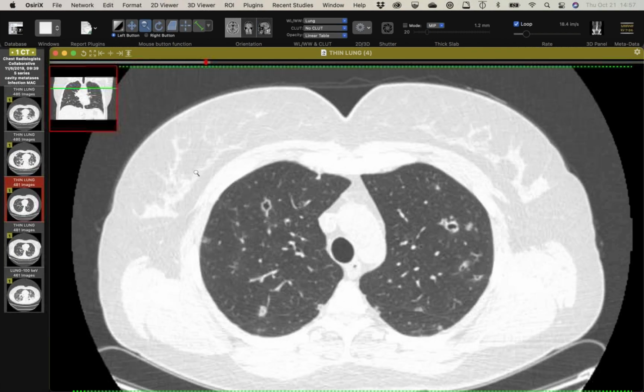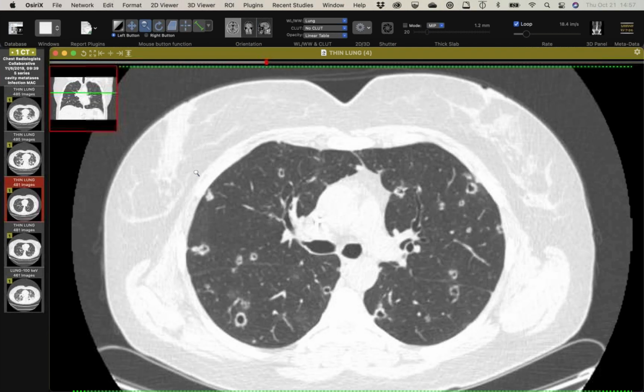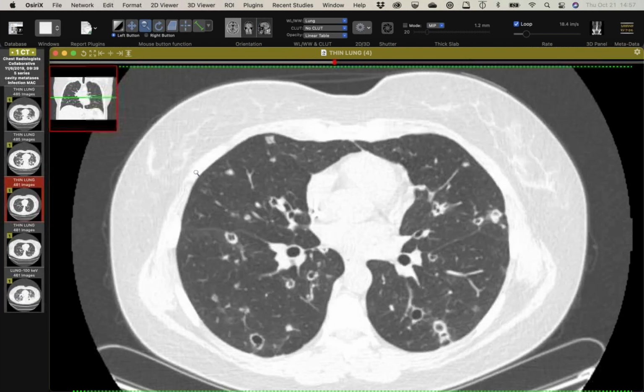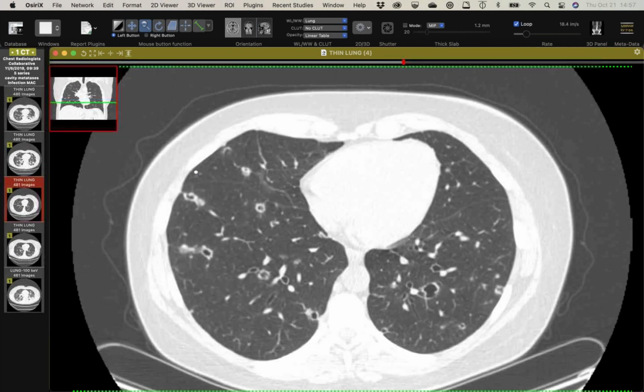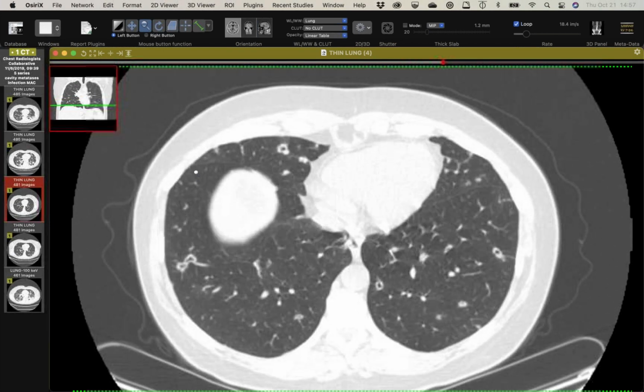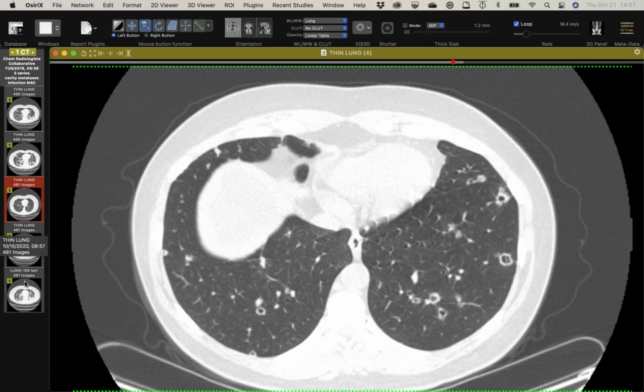They're not quite cystic, cavitary, whatever you want to call them, but they're not solid. And she has a whole bunch of them. And so these have been there for now several years. And she's been on a variety of chemo regimens and bevacizumab and some other targeted therapies. And they were kind of percolating along.